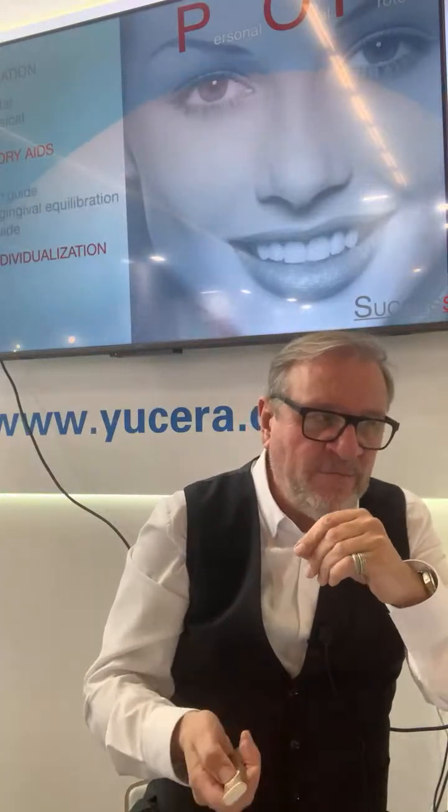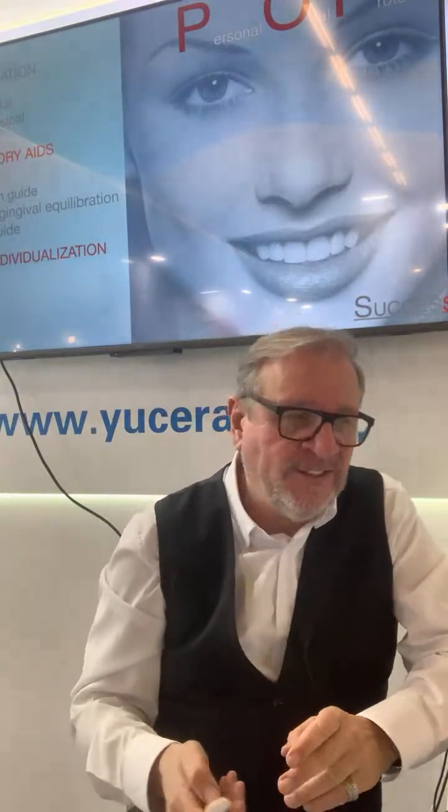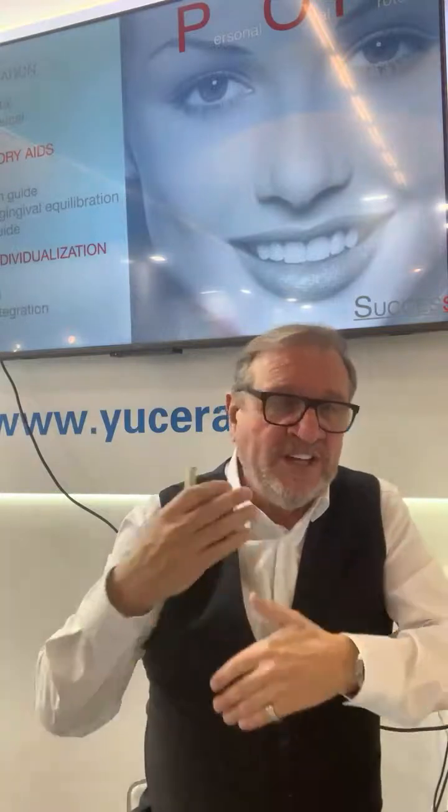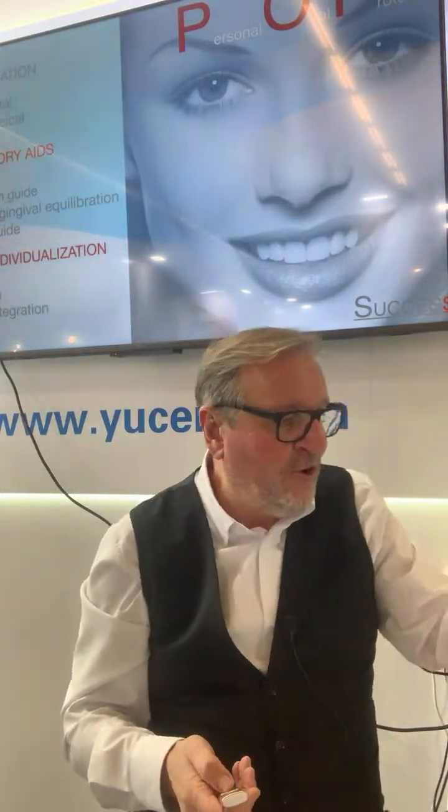The digitalization, the simulation, is the first step. Smile design is the first step to know what kind of work I have to do at the end. And after we can make try-in aids and also use that for individualization.